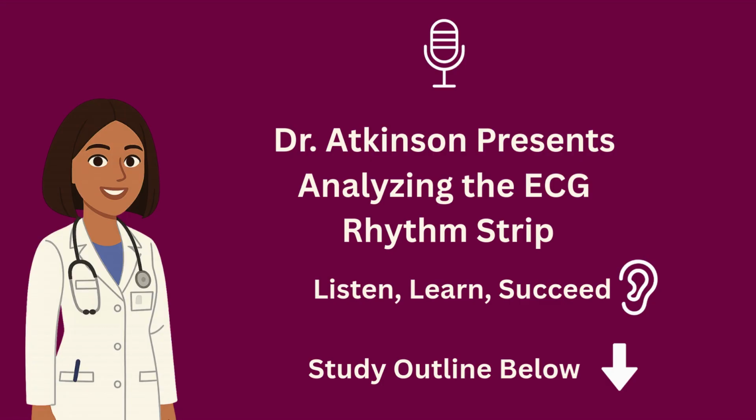Next, let's talk about the systematic approach to interpreting arrhythmias. This checklist helps ensure we don't miss anything. First, determine the ventricular rate and ventricular rhythm. Then measure the QRS duration and see if it's consistent across the strip. If not, identify the variations. Look at the QRS shape. Is it uniform or are there different morphologies? Then examine the P waves. Is there a P before every QRS? Is the P wave shape consistent?